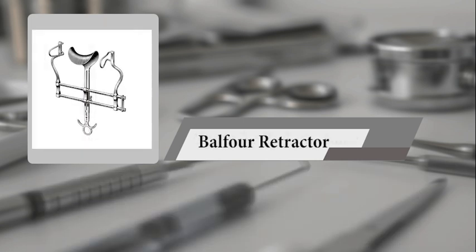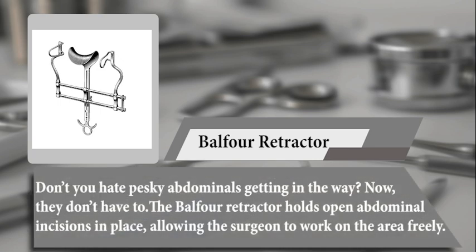Balfour Retractor. Don't you hate pesky abdominals getting in the way? Now, they don't have to. The Balfour Retractor holds open abdominal incisions in place, allowing the surgeon to work on the area freely.